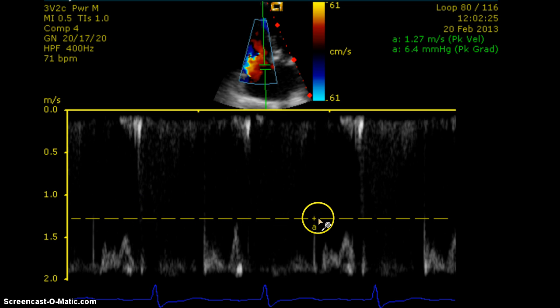And again, this caliper is floating in the screen. It's unclear what's being measured. There's a spike here. Are they measuring the spike? No, they were measuring tricuspid regurgitation. This was actually their TR max, and the crosshair needs to be moved over.